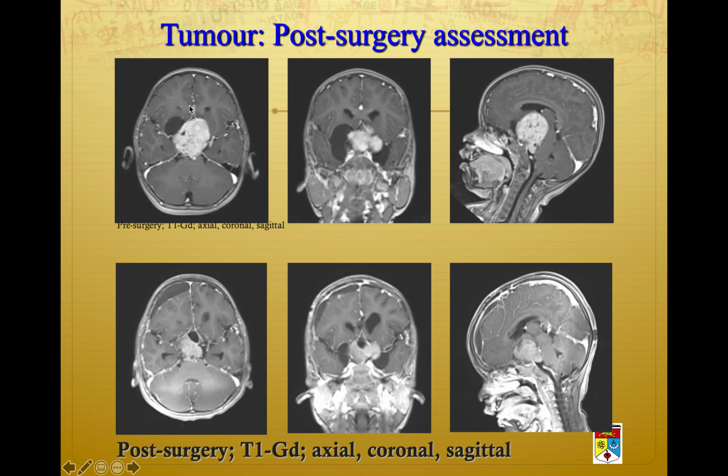Okay, so of course MRI can help in terms of post-surgical assessment, so that's one of the good indications: post-surgical assessment of tumor. And like in the case just now, post-surgery, you see how many percent of the tumor has been removed based on the imaging.